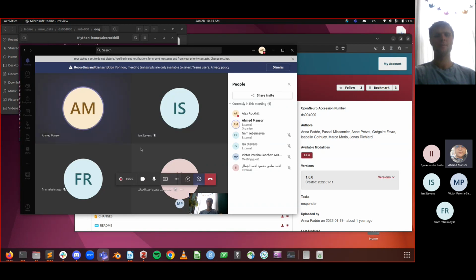Okay, so you suggest to convert each patient to NumPy arrays and combine the NumPy arrays. It will be much more computer efficient. Yeah, as far as computer efficiency, you could take all of the data out in NumPy arrays, or you could load them from disk only when you need them. That's probably the most efficient way. You could either save them to a NumPy array or save them to a FIF file and then load them, and when you're done with them, delete them.